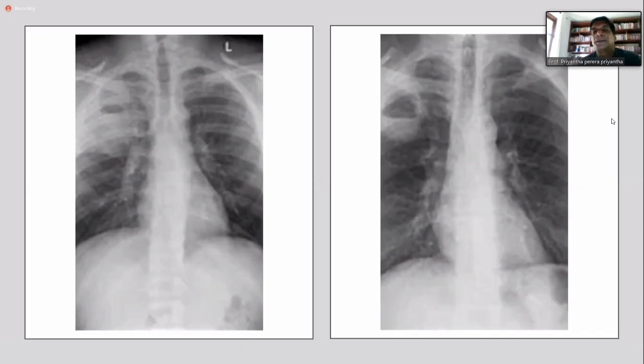And what's the other thing you can get with staphylococcal infections? Apart from abscess, another lung problem, you can get bullae, right? Bulla formation leading to pneumothorax. Again, if you get large lung cavities in the X-ray, then you have to think of pneumatoceles. Pneumatoceles are caused by staph, right?